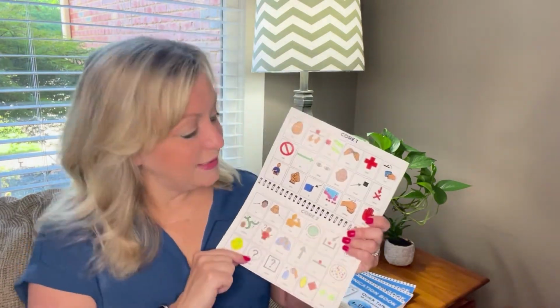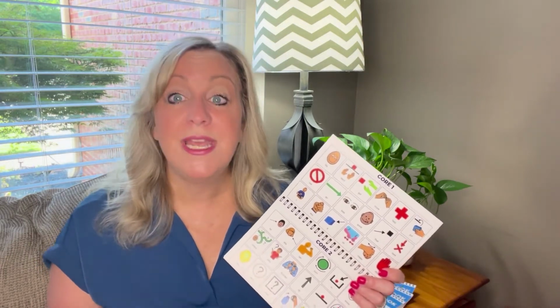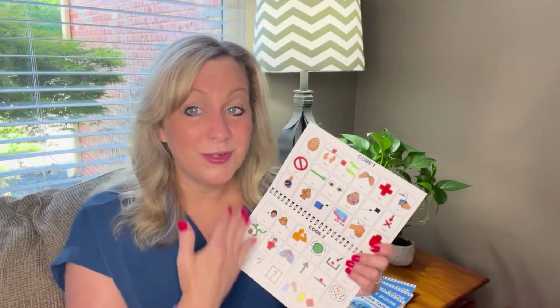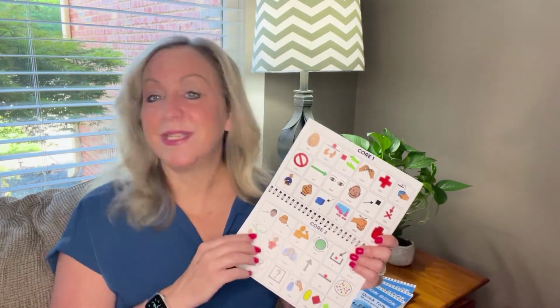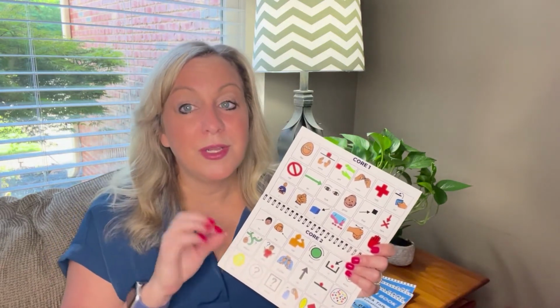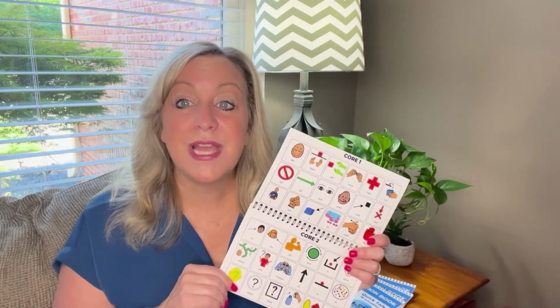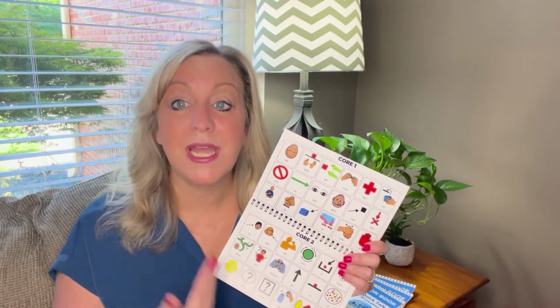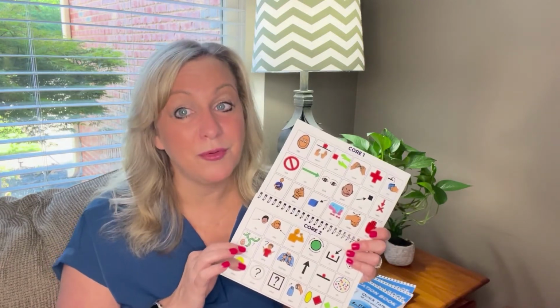Our first 2 pages consist of core vocabulary words. Now, if you haven't encountered that term, core vocabulary, what that means is the most highly frequently used words in our language. There's about 200 to 400 that people typically teach first, because if you can learn to communicate these words, you can communicate about 80% of what you're trying to say. Now, it doesn't include things like fringe vocabulary or specific categories. It won't have people's names in it. It won't have names of places in it, those kind of common nouns and proper nouns. But it does have verbs and adjectives, so action words and adjectives that you're going to use the most in your day-to-day life. That's why this book is really helpful throughout the course of the day.